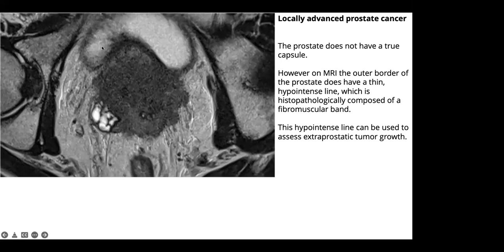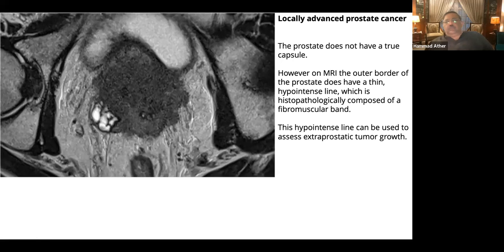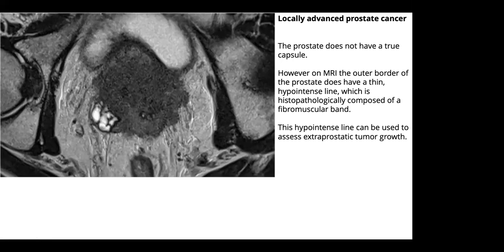Yes, so just by looking at these images, the moment you see this image, you will be confused: where is the prostate gland? We cannot see the peripheral zone, we cannot see the central or transitional zone, we cannot make out the hypointense or black line of the capsule, and there is no hyperintense signal of the peripheral zone that we otherwise expect.